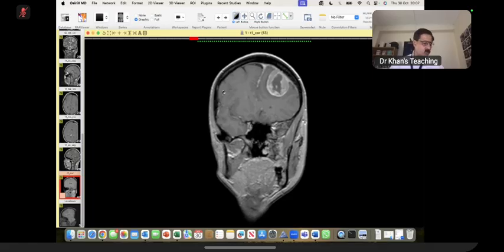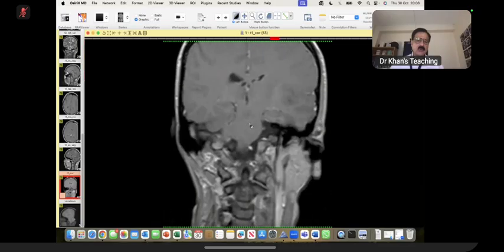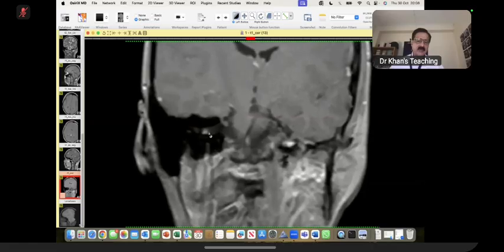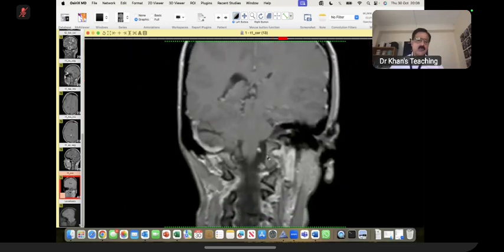Multiple meningiomas, this was only a 36-year-old. Multiple meningiomas with ependymoma. Actually, that was an ependymoma in the ventricle, and acoustic schwannoma. I gave you a hint. Look for that. And you did not. It would have been good practice to ask for, I want to magnify it. That was the key in this case. The patient has got bilateral acoustic schwannomas. And here you see, this is enhancing here, and another one is enhancing here, bilateral. But you did not ask for that.